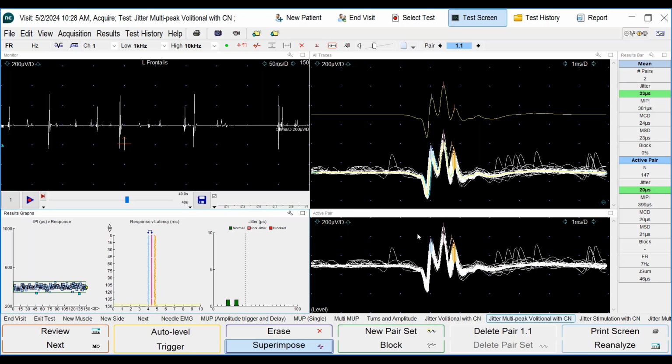If there is interference that you want to get rid of, for example, you can see there are 2 waveforms over here, or 3 with high peaks. So there was some interference. I can use my rectangle tool to get rid of it. So everything is getting better. We have kept the previous good features and introduced some new ones.